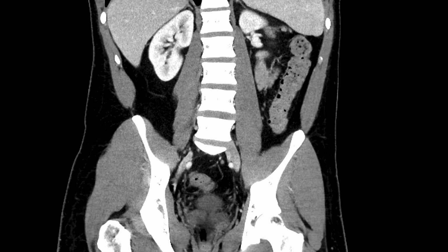So things like pancreatic cancer and how to make sure you never miss a pancreatic cancer, or when you see liver hypodensities, how you know that they're benign or if they're worrisome, or what you need to do when you see various things in each of the organs. And this will likely take place over a few videos in the future, so please stay tuned.